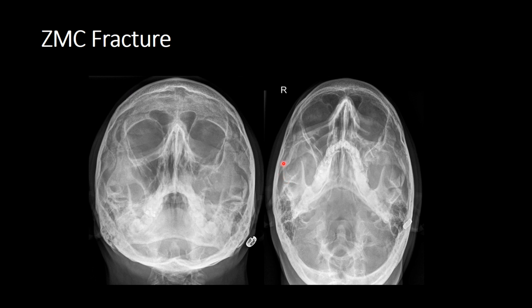So over the superior margin, look at that. That's a nice view of the infraorbital margin over the nasion, medial border, nasion. Big step. Look at that. There's even comminution to it. It's an absolute marked step to the infraorbital margin. We can see the fracture through here. There we go. Look at the inferior orbital margin, and here we can see it's completely smashed in. So the OM30 view is much better at looking at the lateral aspect of the maxillary sinus.